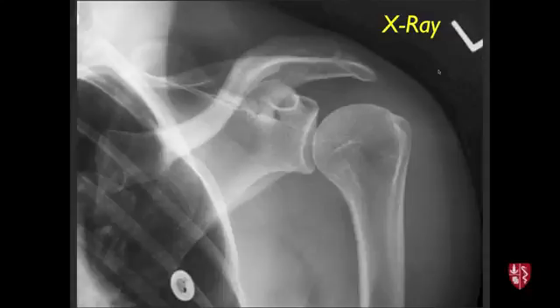There's sort of 4 densities that we can see with radiography from highest to low. So one would be bone. So all the bone is this white right in the shoulder. The second one is true soft tissue, like the muscles along here. The third one is fat density, so a little bit lower signal or density there. And then the fourth would be gas, like air within the lung or outside the patient. And then you might have something extraneous like a clip here or a snap on the gown. That's metal, so that's a 5th density.